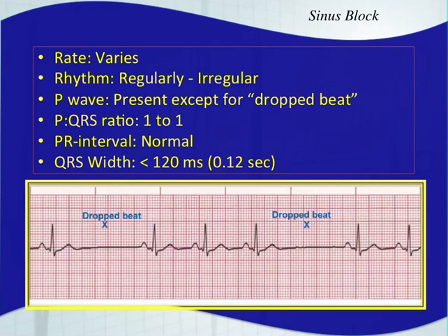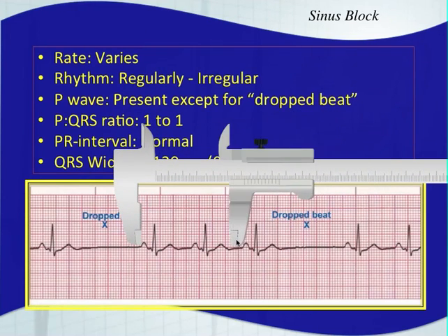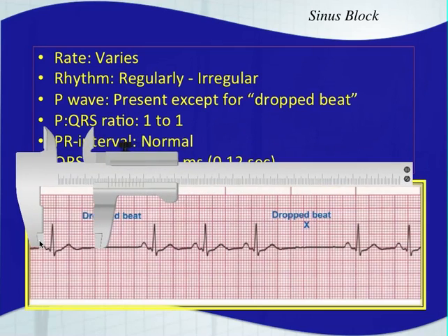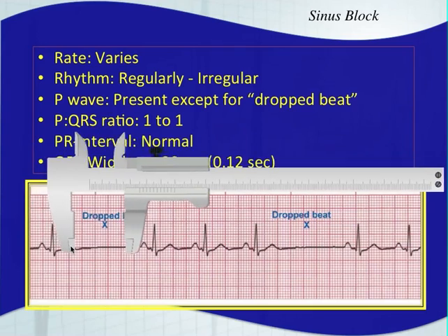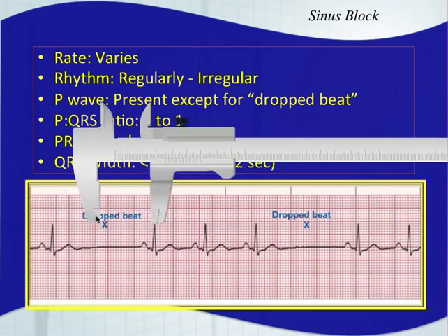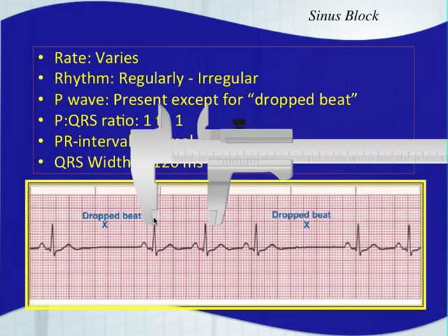Your next one is a sinus block, and it's very similar to a sinus pause or arrest, except it will maintain the rhythm. So you're going to have one dropped beat, and then your rhythm will come right back.